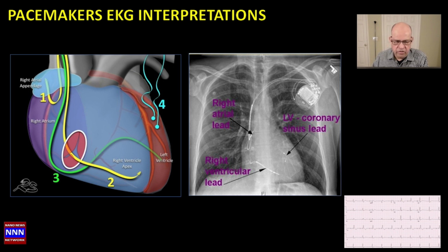We see in patients who have what is known as a biventricular pacemaker, they could even have an ICD, which is an implantable cardioverter defibrillator.